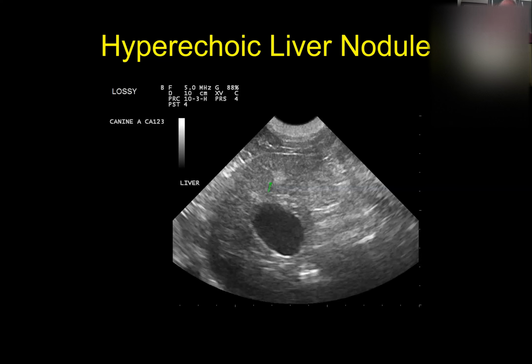Okay. Typically, with nodular regeneration inside the liver or spleen, you may have multiple nodules, but most of the time they're all going to be about the same size. And you won't have 100 of them, you may have 2 or 3 of them. So nodules in the liver or spleen that are about the same size, all relatively small, and either hyperechoic or hypoechoic, there's a good chance those are going to be regenerative nodules. And if you watch them over time, they will go away. Okay.